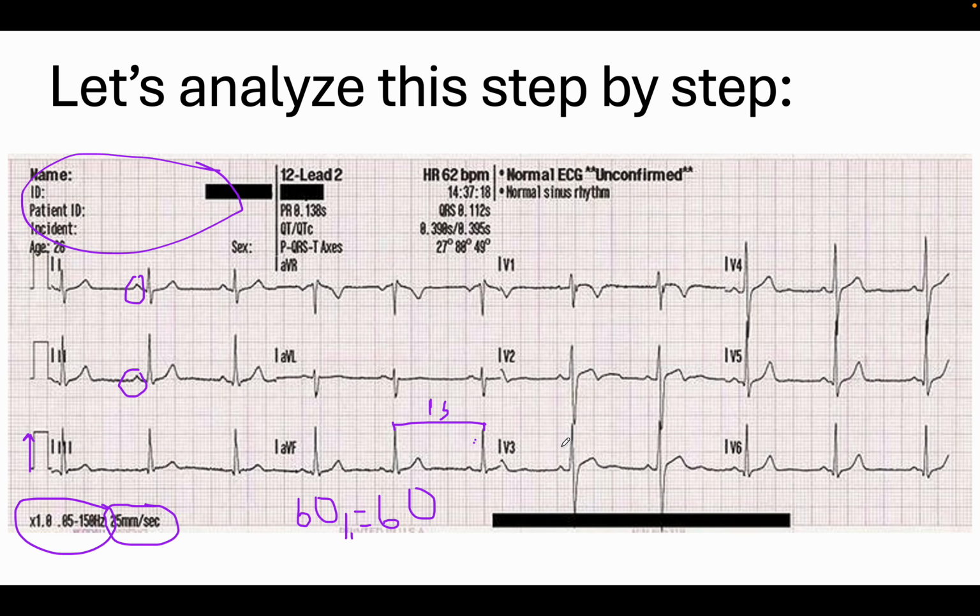And then we look at the ST segments and check if they're normal. ST segments will be gone through more in depth within the STEMI and NSTEMI videos, so keep your eyes peeled for that. But in this case, we can see the STs look normal in these leads here. They look normal here.